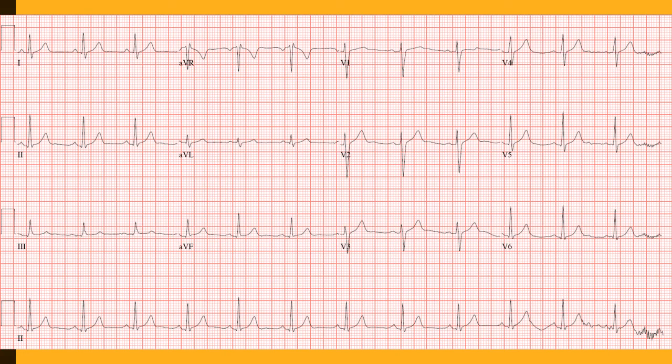This is a normal ECG. Remember to practice so you can look as cool as possible when they hand you that pink sheet.